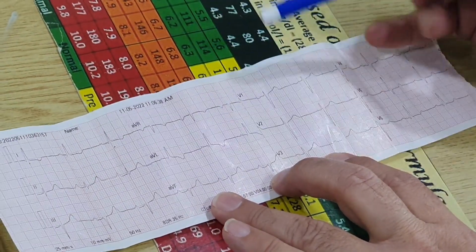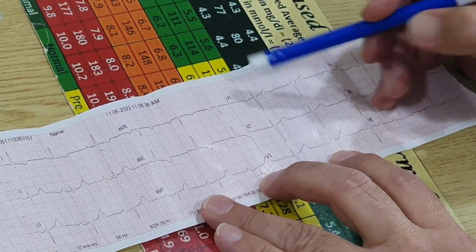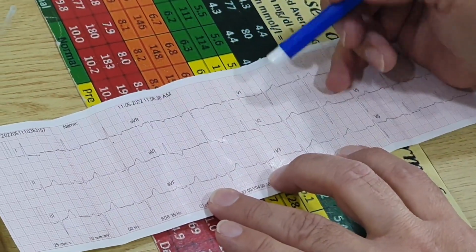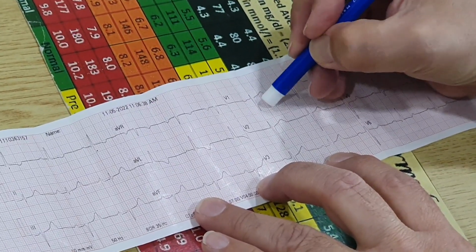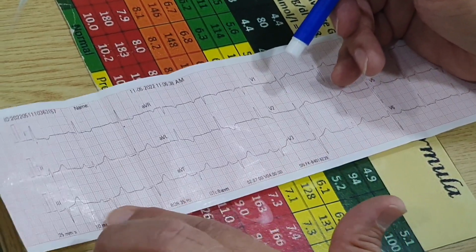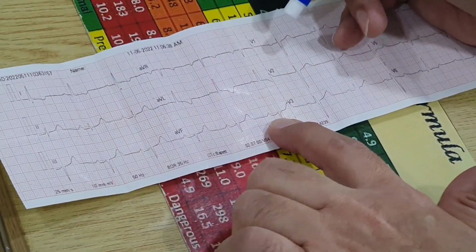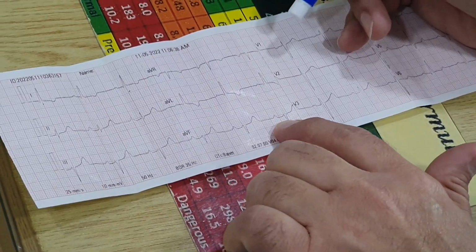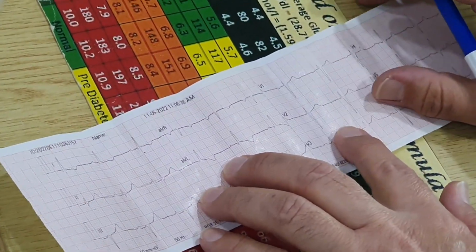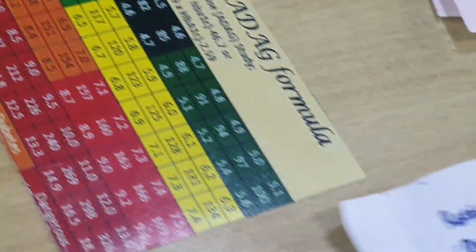Likewise, in this particular ECG in which we had left axis deviation, once again we'll see lead AVL and we'll see lead V3. It has to be greater than 28 millimeters, but I just counted that, and it's not 28, it's about 18. So this does not fit the criteria of left ventricular hypertrophy. Likewise, you don't have broad or pointed P waves, so you don't have right or left atrial hypertrophy. But if you had them, you would obviously see very tall R waves in the respective leads. Thank you.